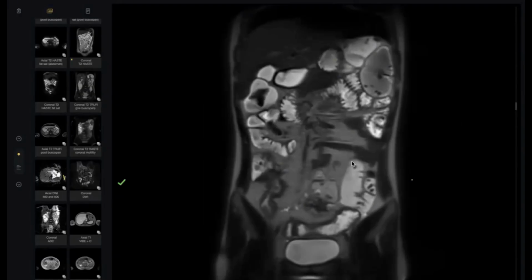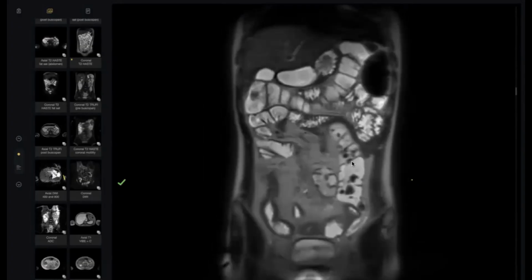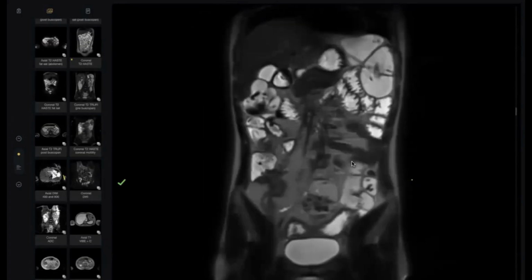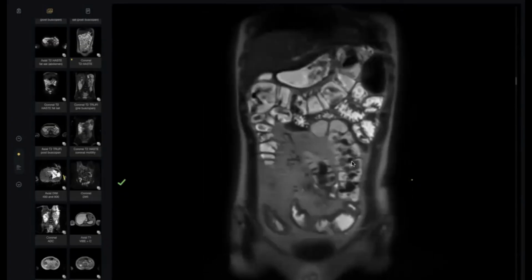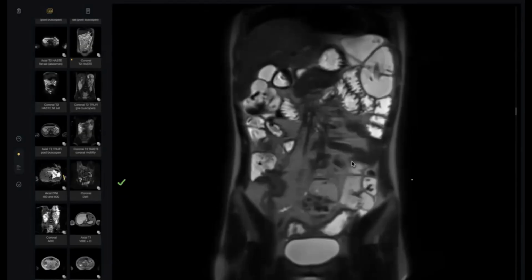What is this? I think these are small ulcers. Again, ulcer or something else? Fistula, maybe. In my opinion, it may be a fistula. Radiopaedia didn't comment at all on this, but really, my colleague, the fistula typically looks like this, and we detect it in coronal, especially in post-contrast and T2.